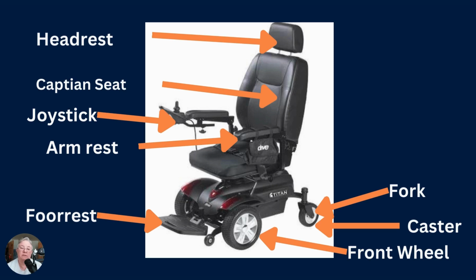There are obvious parts under the casing in the back. You're going to have the batteries and those kinds of things, so those are not too hard to remember. Sorry about that.